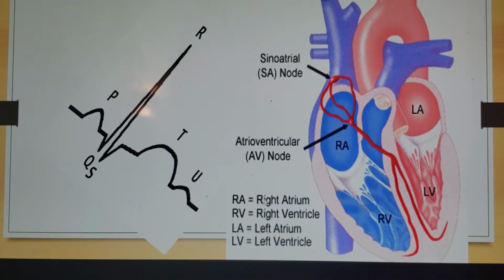So, like I said, with your ST segments, that means there's an abnormality of how there's a depolarization and a repolarization, because there's a portion of that ventricular wall that's infarcting and not responding like it should. And that's where you get ST elevation. So I think it helps you not to get overwhelmed by the shape of an EKG tracing if you start thinking in terms of where the problem's actually at.